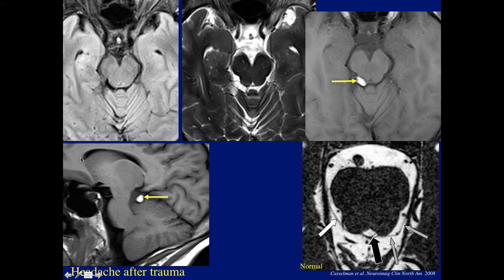This was a patient who came in following trauma and had this small hematoma in the appropriate location, and I was hoping that at least there would be some evidence in EPIC of fourth nerve symptoms, but there were none. So like many literature cases, there's a lesion, but not always fourth nerve symptomatology. But this, you can see, is an appropriate location where the fourth nerve would be running.